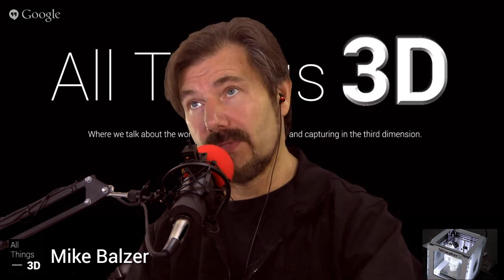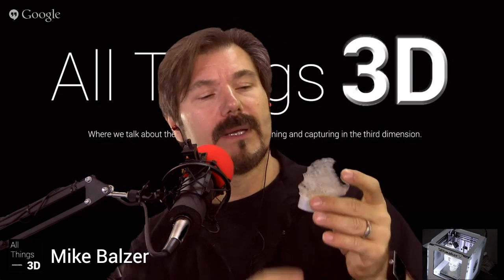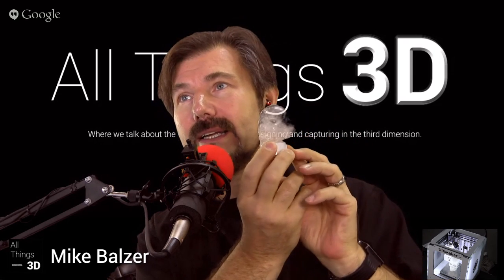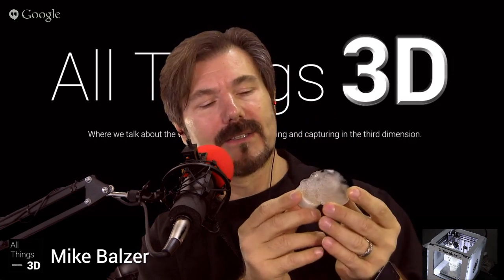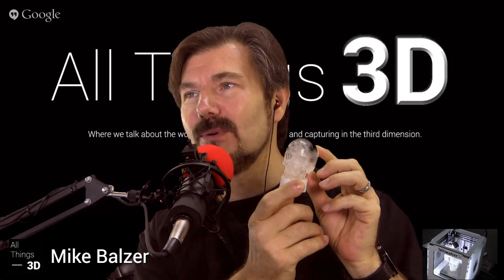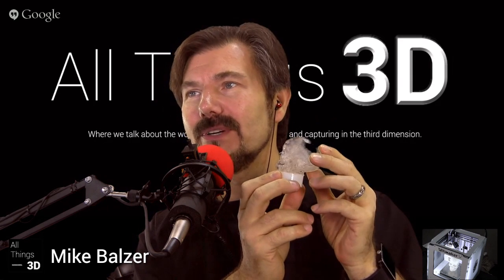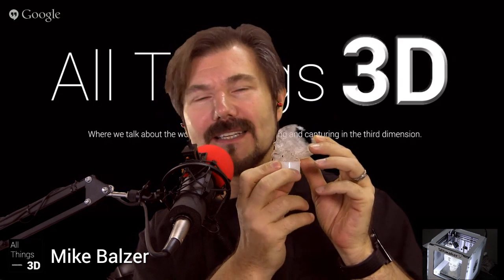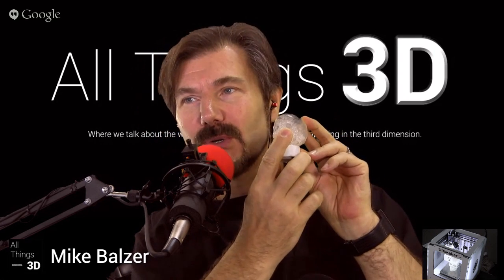And then if you want the best in quality, you can always go to an SLA resin-based print, and this is a skull I created, again translucent, and I mounted it on a little LED light, and the battery's dead, and made a cane out of it for Day of the Dead here in California that we went to. Again, if you look closely, there is a hole in there, so you know whose skull that is.